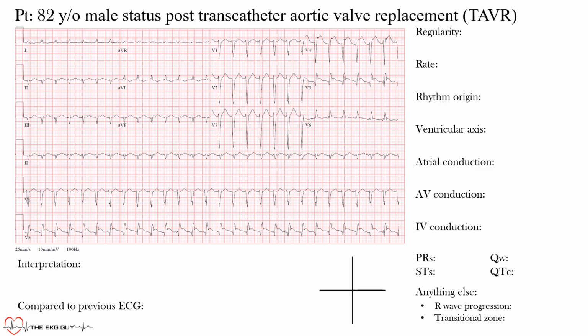Okay, so hopefully you had a chance to go through this. This is quite an interesting case that we had recently. An 82-year-old male, status post, or just completed, this TAVR procedure not too long ago, and presents with this EKG. All right, so let's go through it.